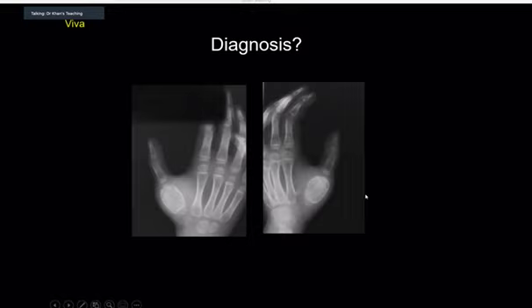So over to you. It's an enchondroma. It's an expansile lesion affecting the entire first metacarpal bone with chondroid matrix. Where is the chondroid matrix? You see, the distal half of the lesion.